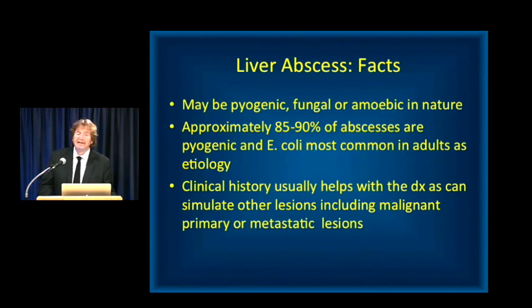And again, clinical history is very important, though I will admit the clinical history of liver abscesses and primary metastatic liver lesions can be very, very similar.